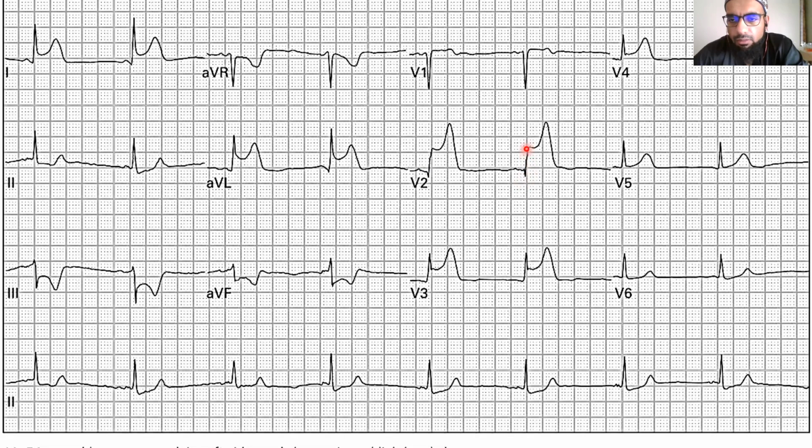So that's your QRS complex. This is your ST segment, and this is your T wave. So we worry about this little part here. And you can see it's raised by 1, 2, 3, 4, 5, 6, 7, nearly 8 little blocks above the isoelectric line. Let's come to the anterior leads, V3, V4. We see that we've got a 1, 2, 3, 4. Here we've got a 1, 2, 3. So we can see where most of the damage is taking place.